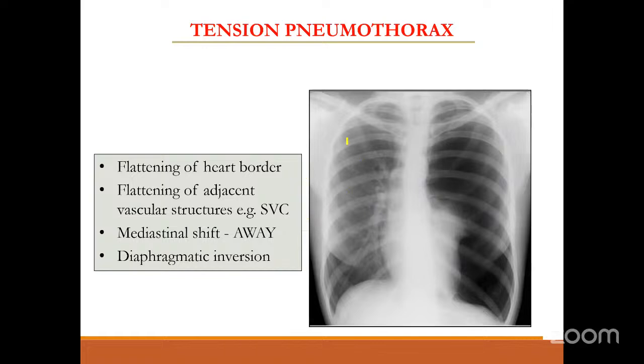Here you can see in this X-ray a gross difference between the right lung and the left lung. In the right lung, you're able to see clear bronchovascular markings, but the left is fully black. So what does this tell? That means there is excess of air within the left, usually happening with pneumothorax. We always read that a pneumothorax is an emergency.